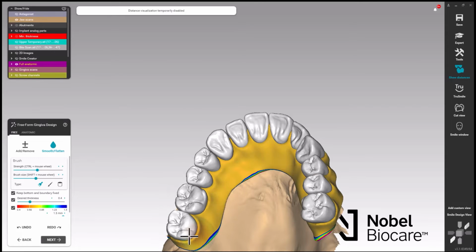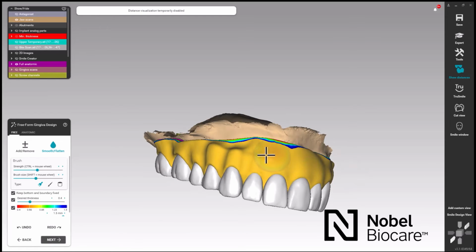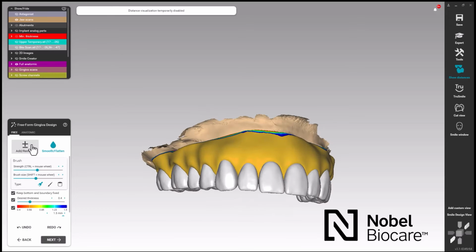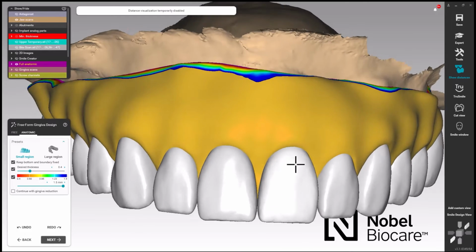And when I'm using this tool, I will use my shift key, which will give it a higher speed, and without it, it gives me a nice smoother. So you kind of just play around with those two, and you'll see how that works. And in this case, again, it's just going to be a pretty basic wax up at this point. I'll fine tune it later.